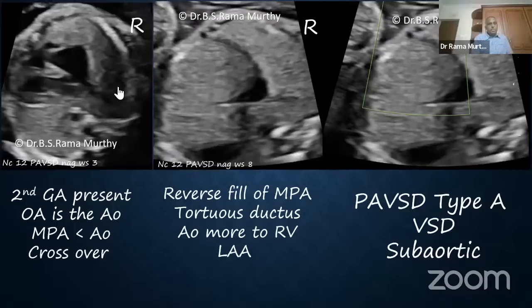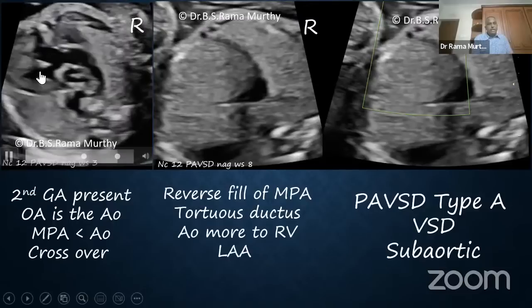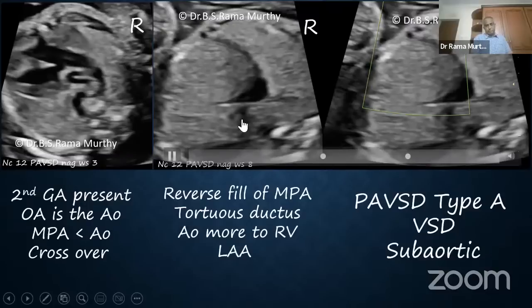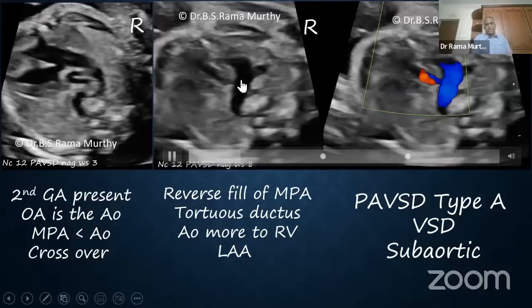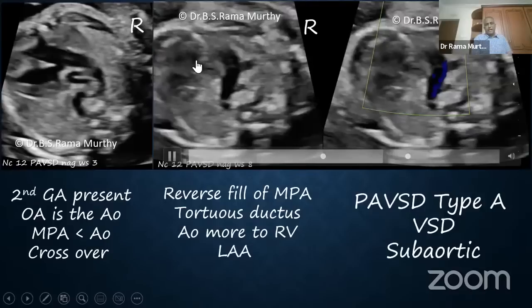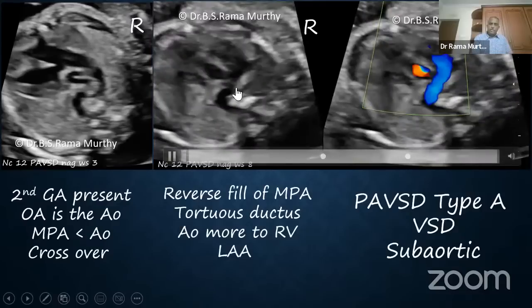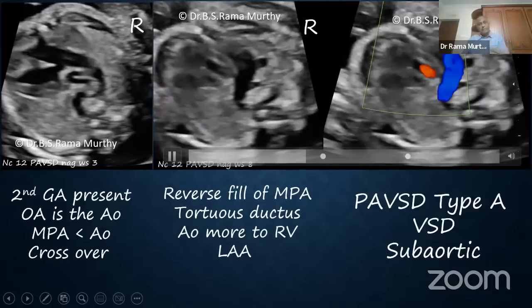Okay, so this is an axis rotation, overriding aorta, very clear, easy. I also see something tortuous here, but I'm not going to mind that now. I'll keep that in the back of my mind. I'll go to this clip. That is the aorta. It's a left-sided aortic arch, no problem. But I see the other great artery coming from the right ventricle, which is much narrower. So the first thing I'm going to think is overriding aorta, a narrow pulmonary artery.